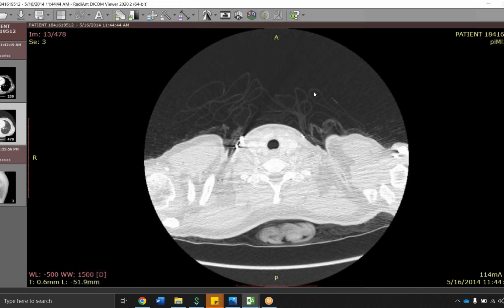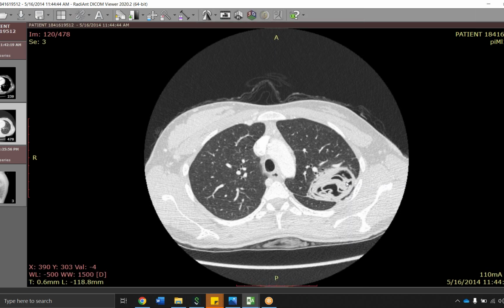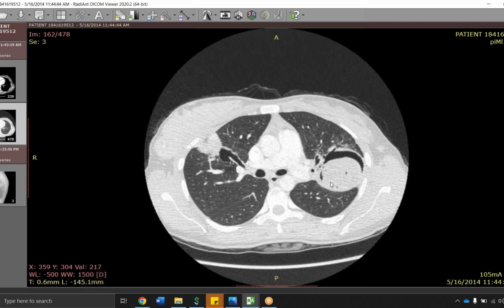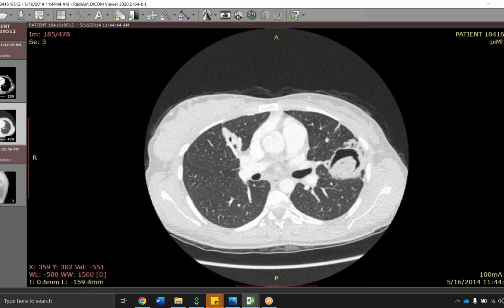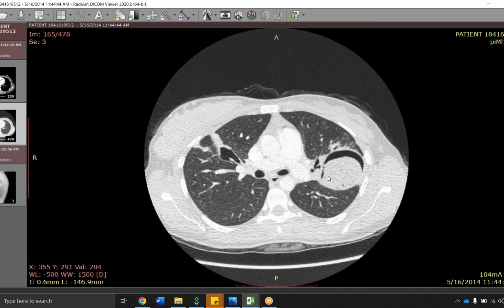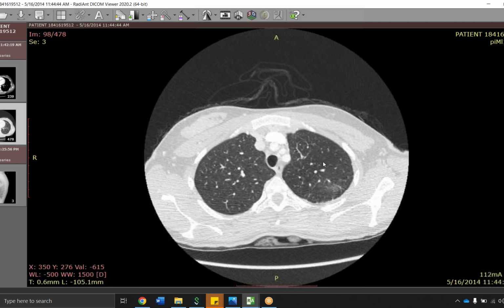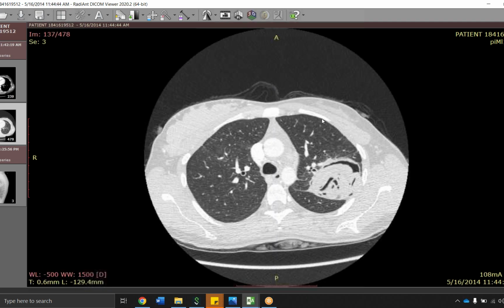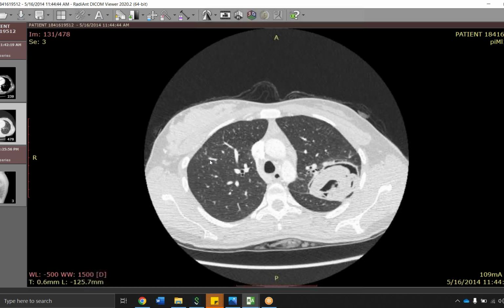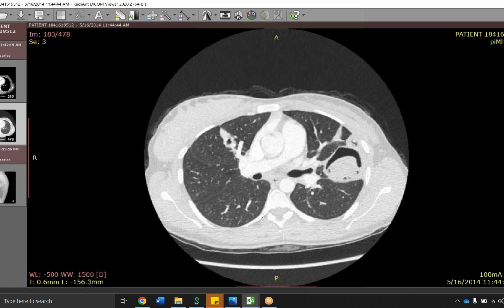And if we go to this patient's CT to look at this lesion, this is what we see. There's a large cavity with all of these folded membranes within it. The relevant history is that this patient grew up in the Middle East and recently immigrated to this country. And what this turned out to be is pulmonary echinococcus.